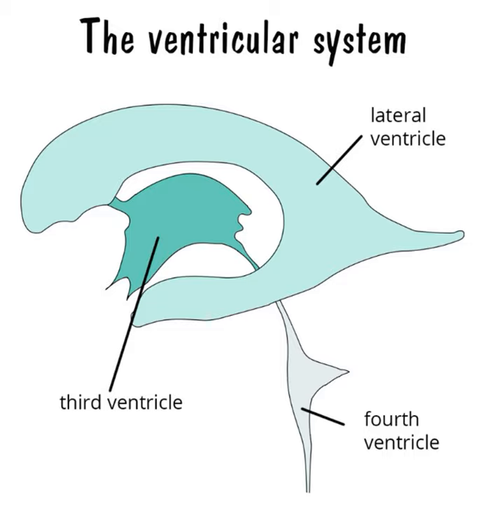Beyond 10 years, into the second decade of life, the sulci tend to be less conspicuous. The ventricles tend to be less prominent, and this is normal. So the ventricles can appear slit-like, but the sulcal spaces might not be evident at all. But the basal cisterns will be normal. That is important. If the basal cisterns are obliterated, then you can definitely consider a case for ventricular obstruction.